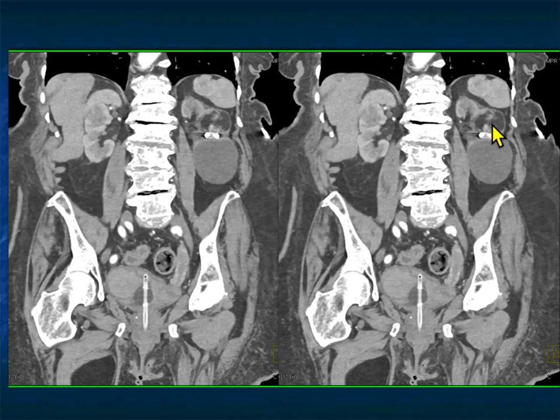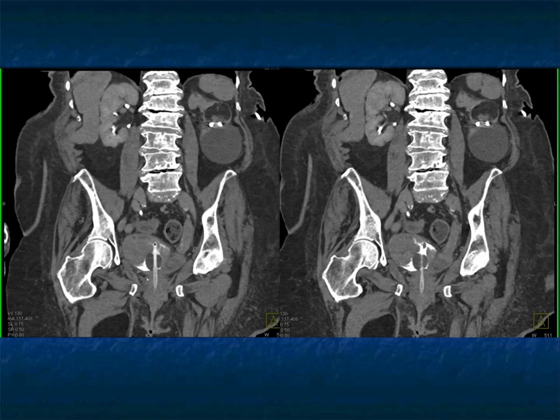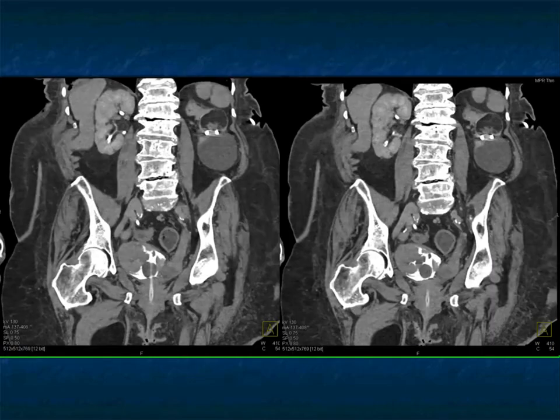Patient has an angiomyolipoma in the kidney, some calcifications, but this problem is distal ureter into bladder, TCC. A little bit of enhancement of the very distal ureter, maybe some faint dystrophic calcifications are present as well. Just a good look at showing you this infiltration. That's a TCC involving the ureter and the bladder, growing from ureter into bladder in this case.